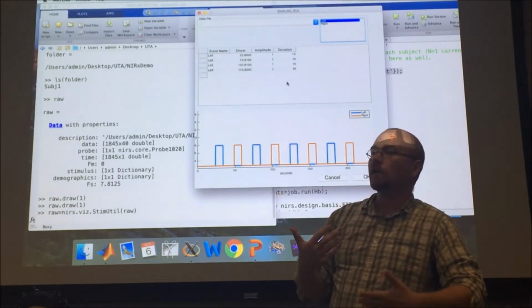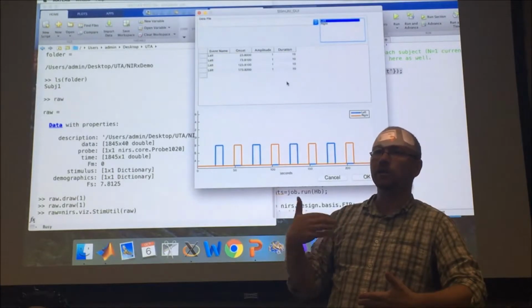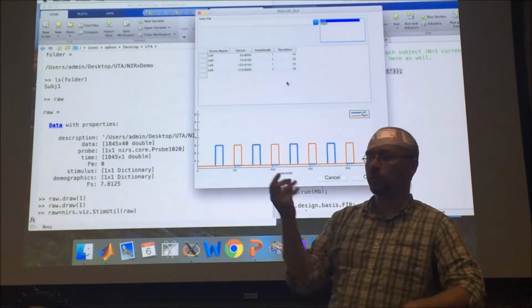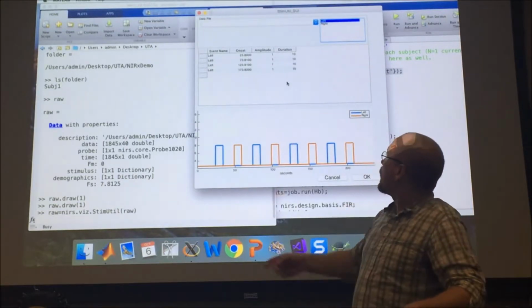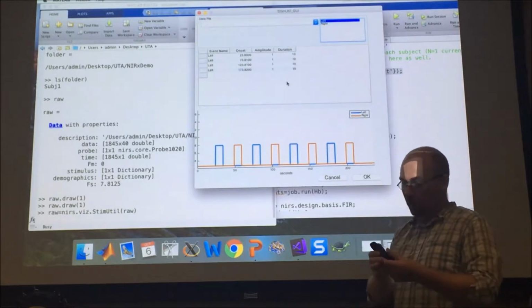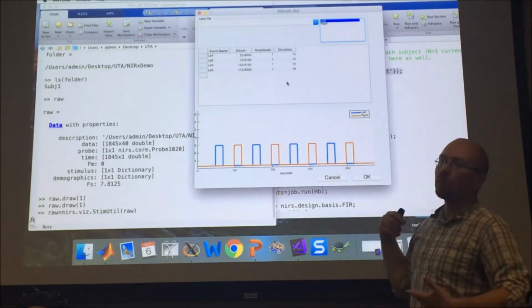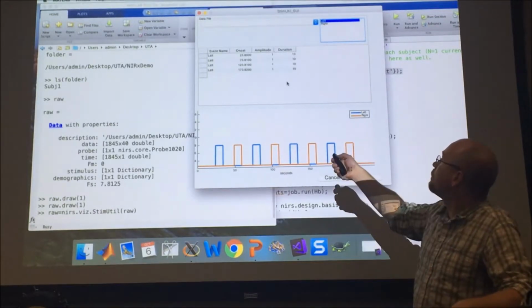And I wanted to ask the question, what part of the brain covaried or changed according to reaction time or motor speed? What I could do is change this amplitude field and put in a variable here that's more meaningful. So I can actually put the reaction times in this field.